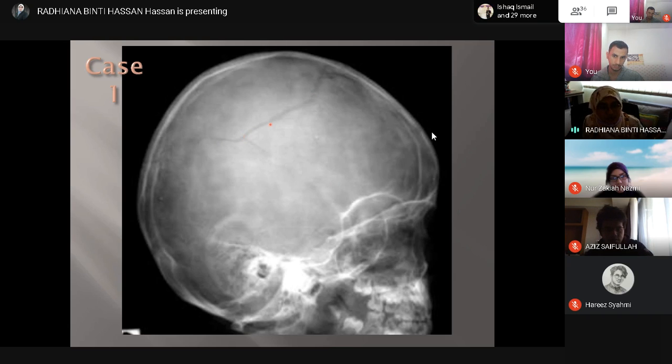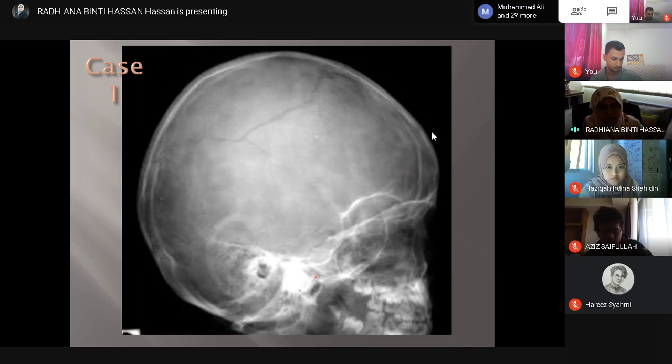And whenever it's a fracture, so most probably it's trauma, so you have to mention about any radio opaque foreign body that you can see, and then you see surrounding whether any soft tissue swelling or the scalp hematoma or not. Okay, so this sclerotic part usually is normal because of the mastoid region and the overlapping bones at the base of the skull.